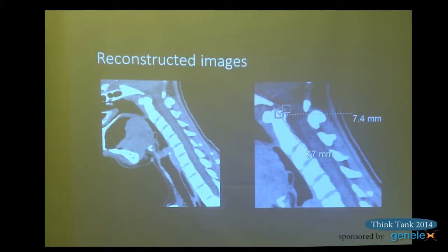Here's a reconstructed image from a flexion view. And it's remeasuring a Grabb-Oakes measurement, showing that there's both bone from this odontoid and soft tissue touching the lower part of the medulla or upper spinal cord. And this is in essentially a neutral position. There could have been more motion to generate more impingement.